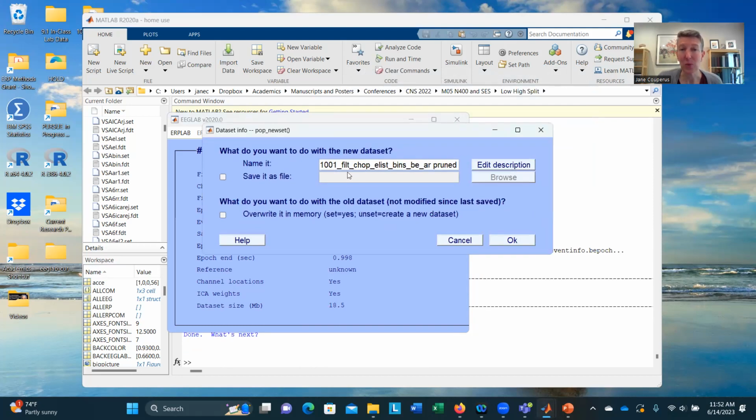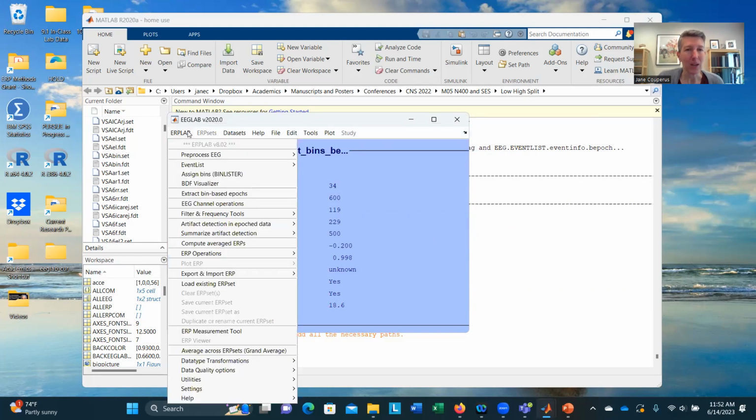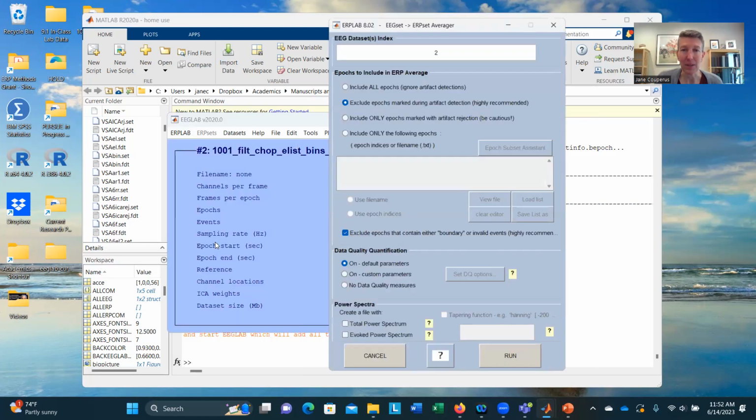It's going to ask me to name it. It's going to add on new stuff to the end. That's great. That's fine. You might want to save this to the desktop somewhere, or your computer somewhere. Go ahead and do that. I'm not going to do that for today. Then I can go ahead and create an average of my ERPs.